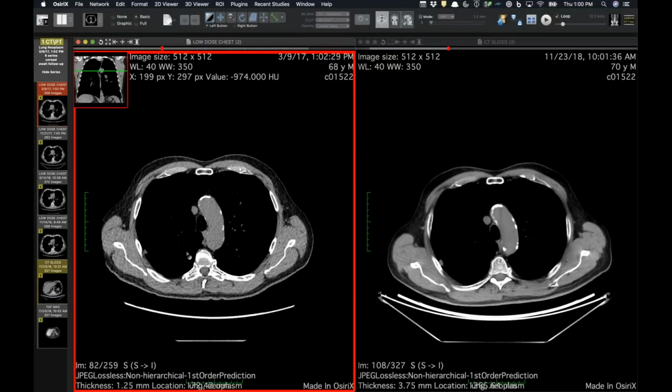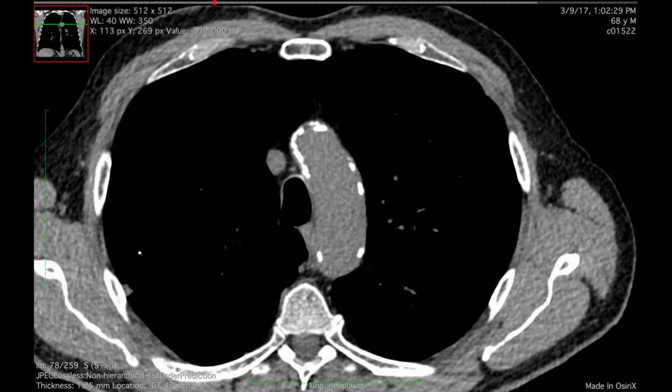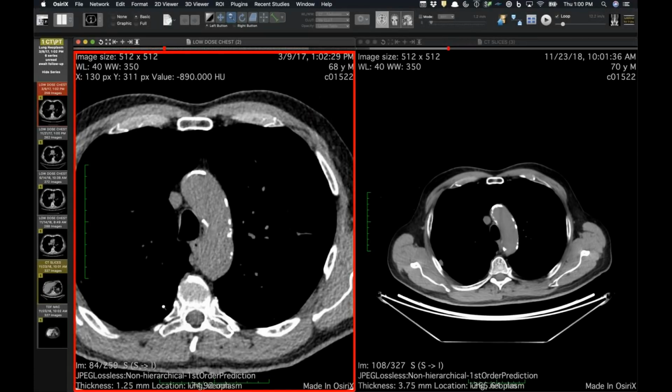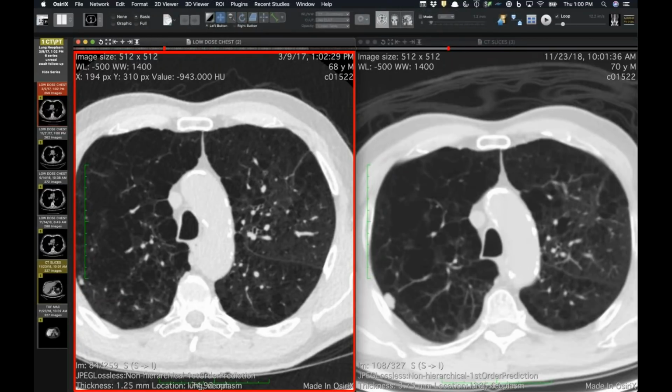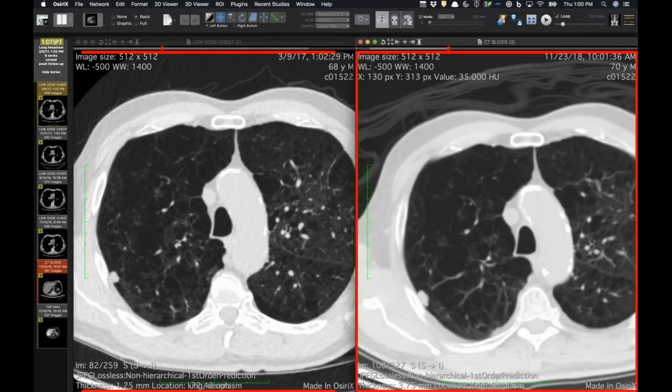And when you look at it, if I zoom in here, it's too small to say if there's really macroscopic fat in it or not. But one question is, have you guys seen intrapulmonary lymph nodes that are this lobulated, or could this be just some sort of smoldering granuloma, or what would you do about it at this point? Take it out? Yeah, I was going to say that, because I've never seen a lymph node that was lobulated and kind of grow. I've seen lymph nodes wax and wane, but I've never seen them just progressively grow without a good explanation.